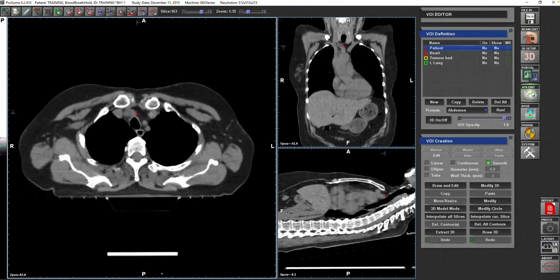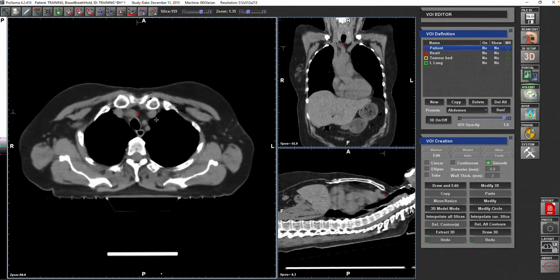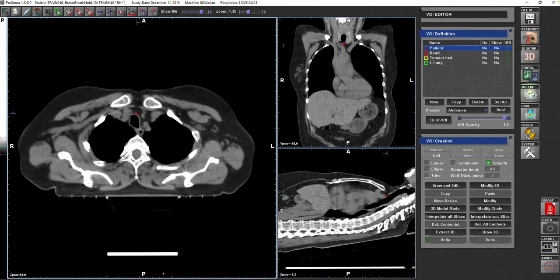And don't also mistake that the subclavian can make an arch, but this arch at this time will be very anterior. The relationship between the subclavian artery and subclavian vein, you need to be aware of it.